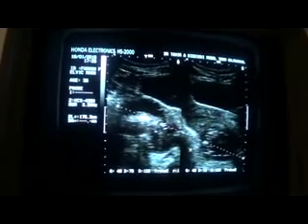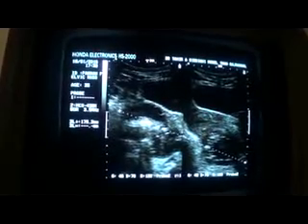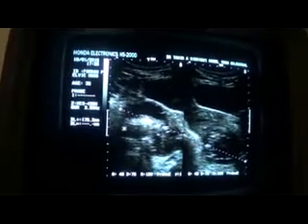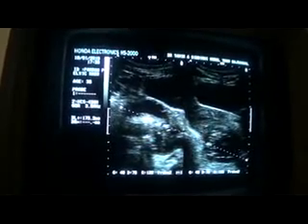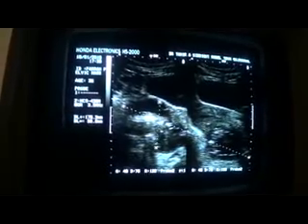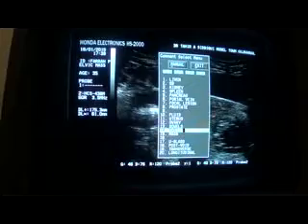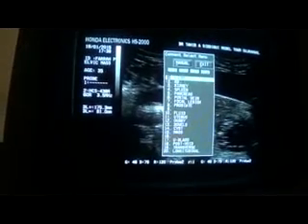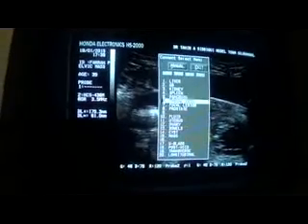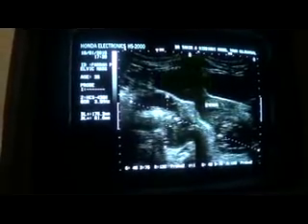or a collection in the pelvic cavity, and then extending into the right lower abdominal quadrant, right iliac fossa, is consistent with the cause of her pain in the rectal region. Now, what can be the cause of this collection, I may not be able to frankly tell you, but this in fact is not a classic picture of a bleed.